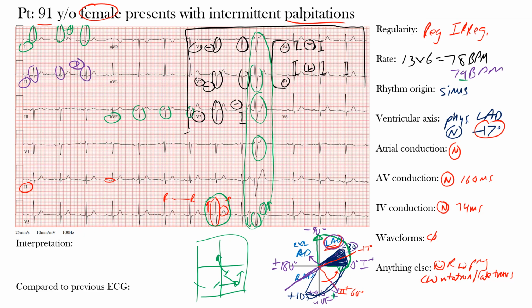Okay, now in terms of the P wave to QRS ratio, there's often none unless you have that retrograde P wave conduction present. Okay, there's no PR interval because there's no P wave. The QRS interval we said is prolonged, so greater than 110 milliseconds, or at least sometimes some will consider that 120 milliseconds, as we see here, and that abnormal QRS morphology. Okay, notice that the QRS complexes have a different morphology. Okay, these complexes here have different morphologies than those that surround them. Okay, so that's one thing to know. There tends to be no grouping or dropped beats present.